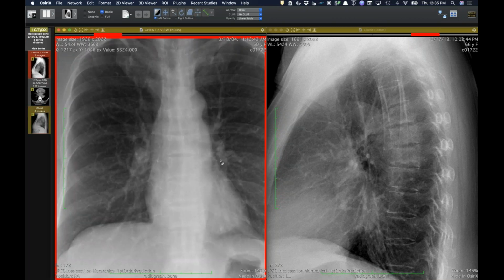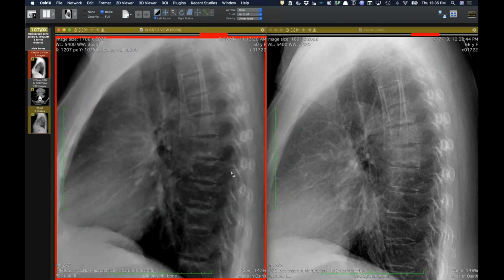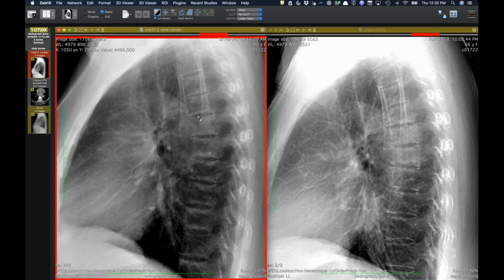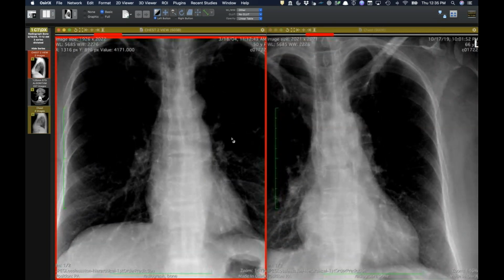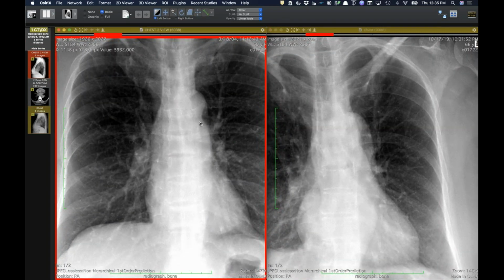I'll show you the radiograph that she had 15 years ago, and you can see that there's similar, it's progressed, but there's definitely increased sclerosis at this vertebral body level, all 3 of these levels. It's more conspicuous than now. And Howard, after you point that out, let's look at the PA view. I don't see as much of that, or really any of that paraspinal widening. I think this is aortopulmonary interface here. Yeah, that's a good observation right there.